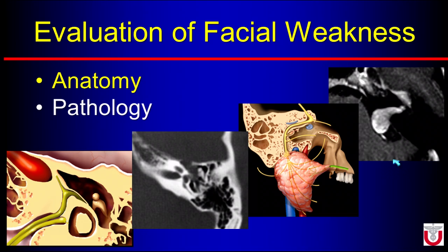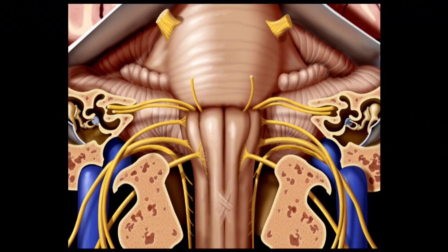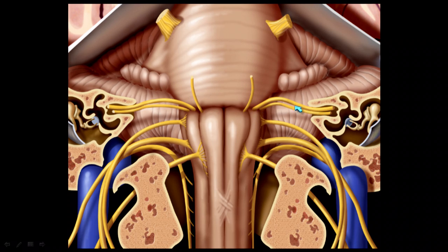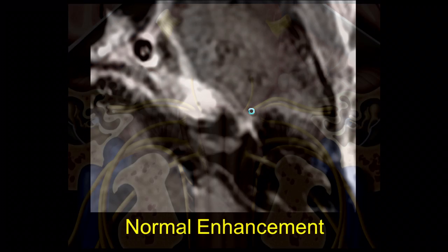The important thing is to think about any pathology in an isolated cranial nerve deficit problem. So again, just like that anatomy, we're going to start with pathology centrally and go out distally along the facial nerve course. So here's the pons, here's the medulla. So there's the pontomedullary junction. So here's 6 coming out off midline, and we see 7 and 8 here ventrolaterally going over to the IAC. So we think about any pathology that can happen along that course.